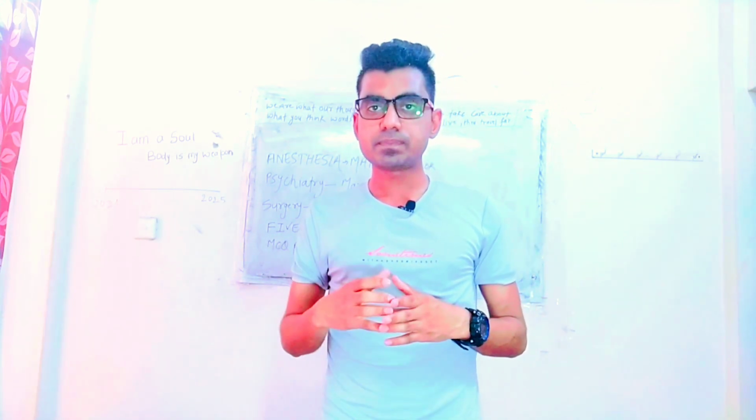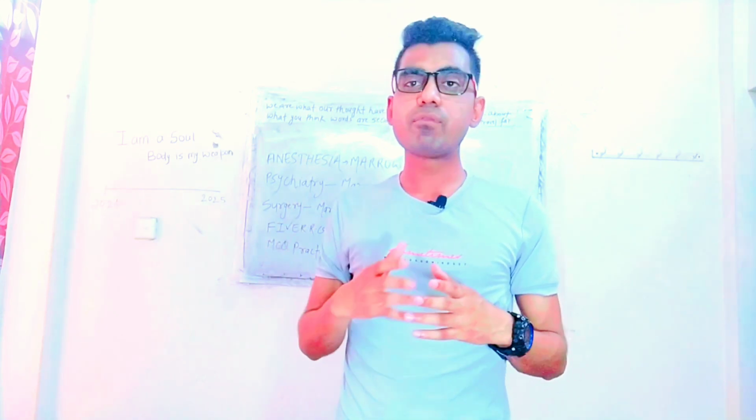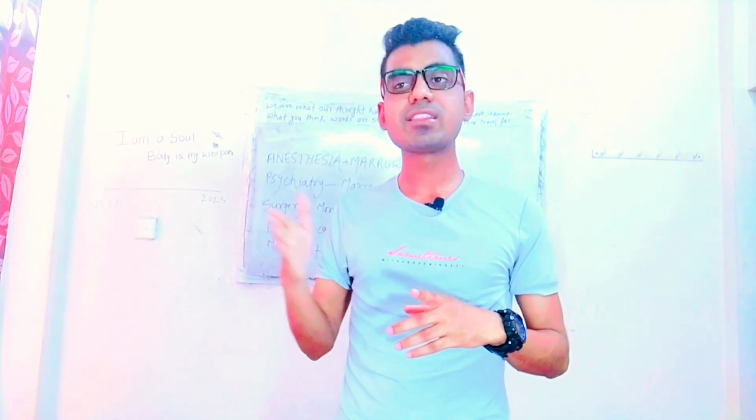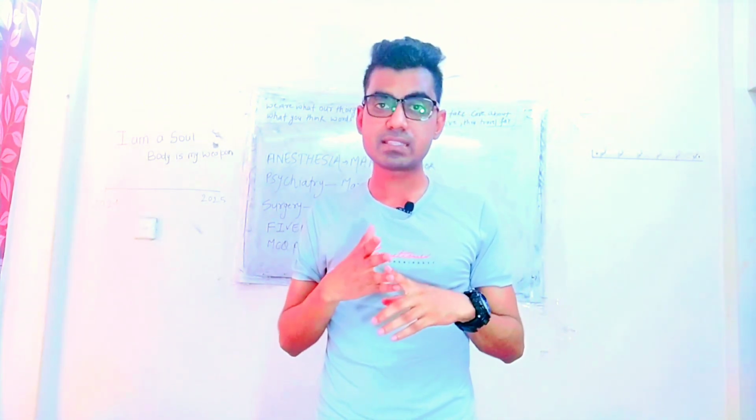Now let's talk about the sizes. When we talk about the size of the blade, it mainly ranges from 0 to 4, and most commonly sizes 3 and 4 are used for adult patients, and 0, 1 and 2 are mostly used for infants as well as children, right?